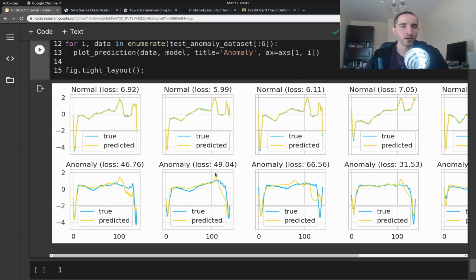And you can play around with the threshold based on the errors that you want to make and be more conservative or more aggressive, maybe depending on the staff that you have or the patient that you have, and use basically this autoencoder to detect heart failure or some heart anomalies.